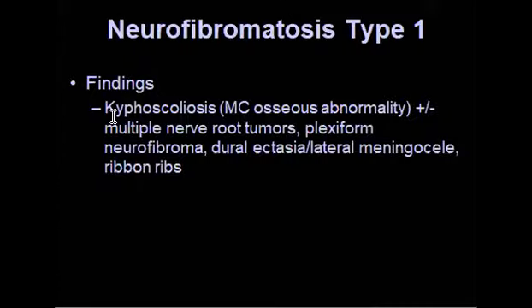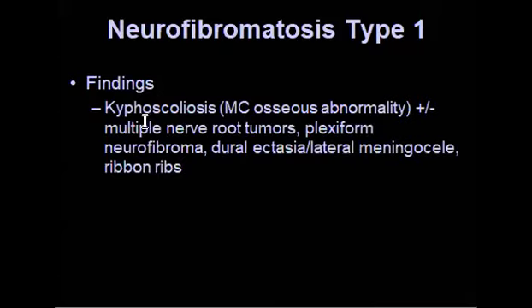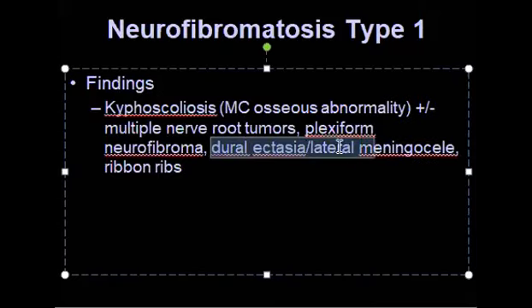Okay, so this appearance, if you saw it with this bizarre acute angle cervical kyphosis, remember syndromes like neurofibromatosis type 1 would have kyphoscoliosis. Yes, neurofibromatosis type 1. The characteristic is dural ectasia and kyphoscoliosis. Yeah, angular kyphosis. Nirmeen, thank you, Nirmeen. Welcome.